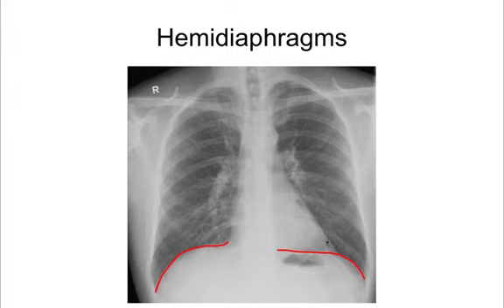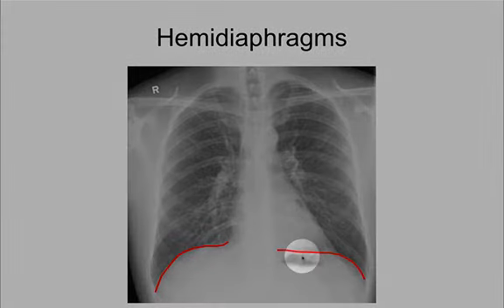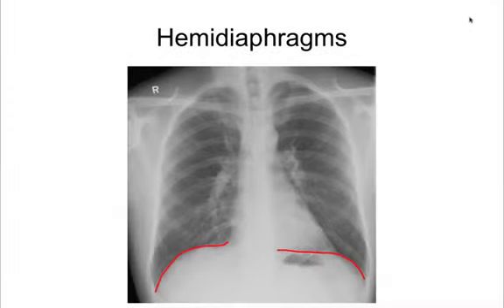What's that, Aggie? So there we can see the gastric bubble in the stomach. So that's not air under the diaphragm? No, that's normal. Okay.